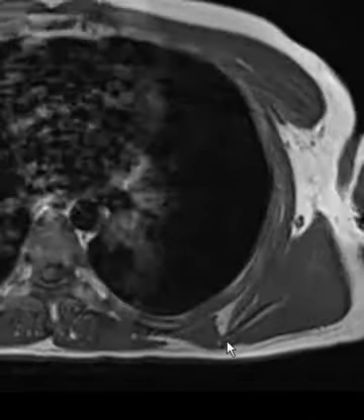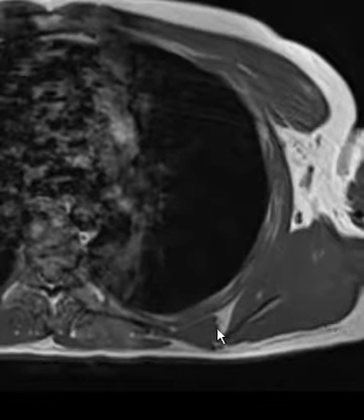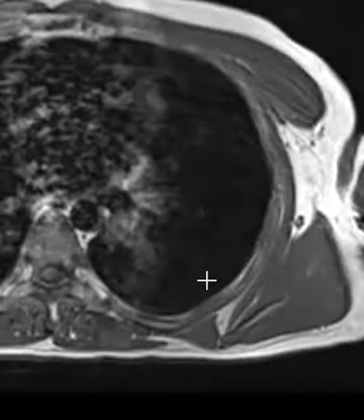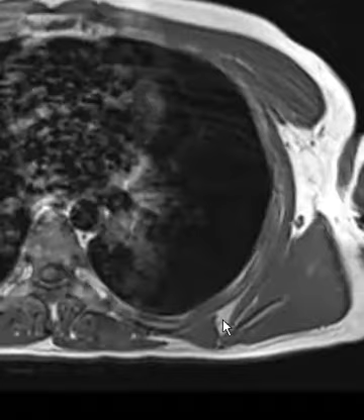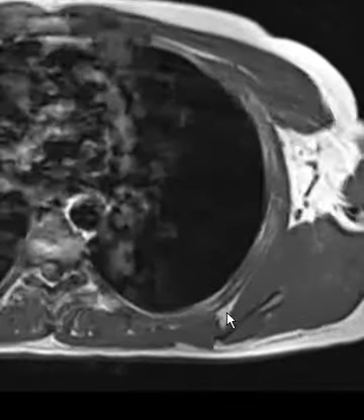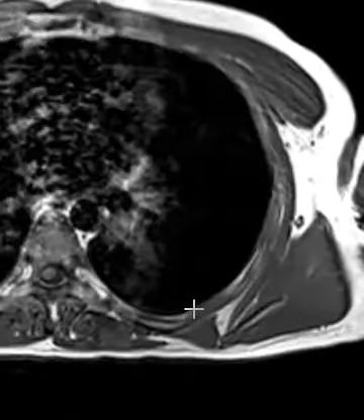If we put up a T1 weighted sequence, we see the areas right here, the little triangle with a little bit of fat within it. And that's where it was. It looks like maybe it has some little fatty elements and some little vessels or maybe fibrous material centrally. Hard to tell in this T1 weighted sequence.